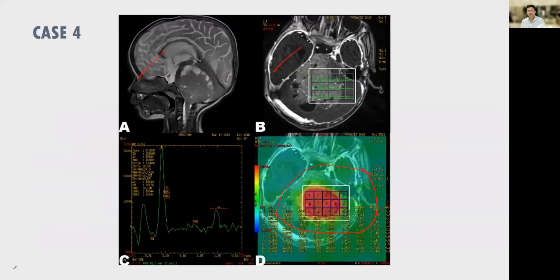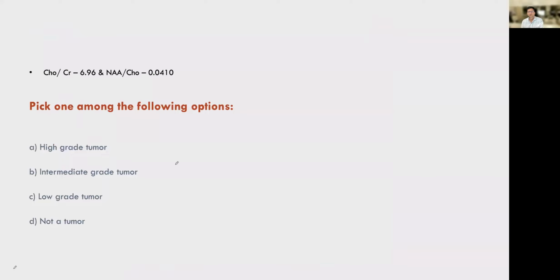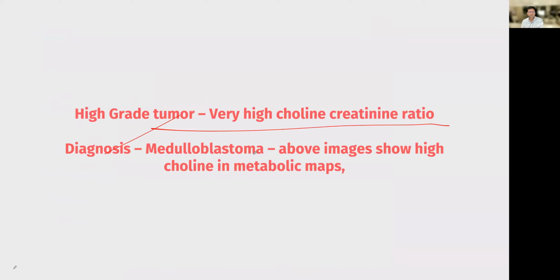And also you have to understand this is exactly not the ventricular type of medulloblastoma. This is the sonic hedgehog, SHH variant of medulloblastoma. Medulloblastoma, there are three: wingless medulloblastoma, which is exactly very near the CP angle, the parenchymal medulloblastoma, which is called sonic hedgehog variant, and the intraventricular lesion. So this is a case of sonic hedgehog variant of medulloblastoma, pathologically called desmoplastic medulloblastoma.